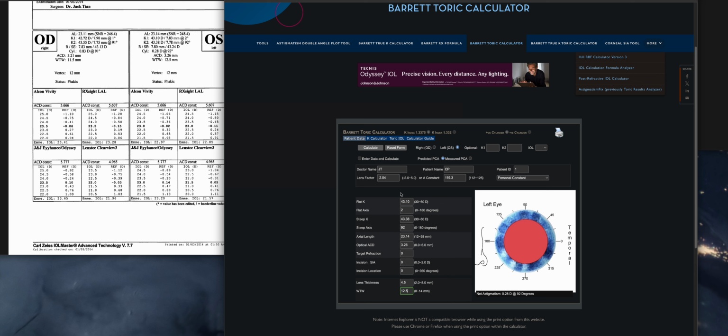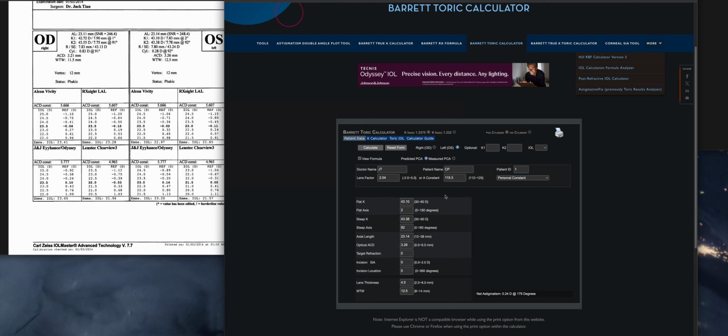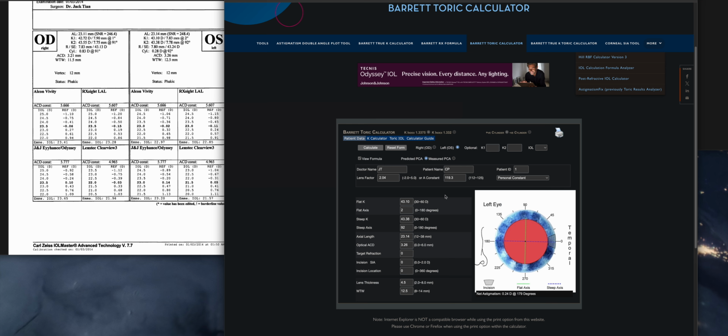And again, I don't know why the 500s white to whites are so odd and off. You don't expect that. The two eyes are not going to look like different sizes, you know, the colored parts of the eye. So that's really weird. I think it doesn't do that very well. Okay, calculate. Good. And then toric IOL.